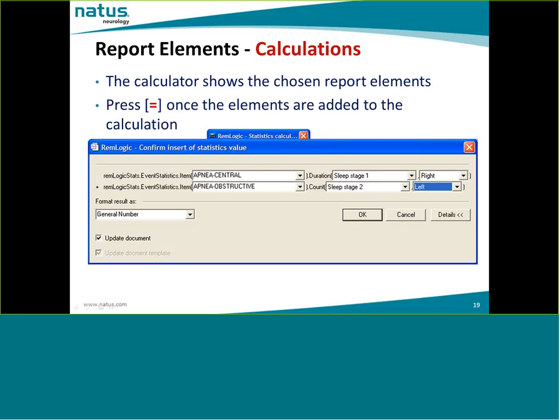Then you can choose the events that you wanted, in which sleep stages that you wanted, and position. But please bear in mind that you should not use events within a calculation which are based on a different time base. If not, you'll receive a lot of errors when you generate the report.